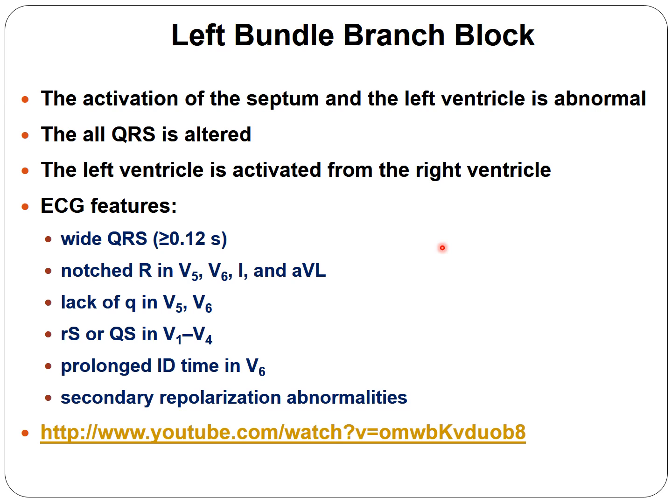Left bundle branch block, summarizing all this. Activation of the septum and the left ventricle is abnormal. The whole QRS is altered. The left ventricle is activated from the right ventricle through the muscle. ECG: wide QRS, notched R wave on the left side. Lack of initial Q in V5, V6. RS or QS, however, in V1 to V4. The prolonged ID time on the left side, such as in V6, proves that it's a left bundle branch block. And for sure, we always have a secondary repolarization problem.